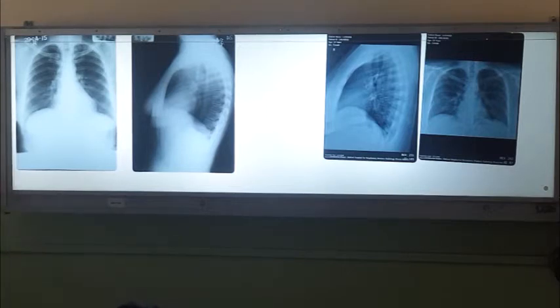Other thing is the X-ray exposure, right? Just remember like this, your intervertebral discs should be barely visible through the cardiac shadow if the exposure is good. Intervertebral discs should be barely visible through the cardiac shadow. If you can see the whole spine, then that is overexposed, so everything will be dark. And then you can easily miss a pneumothorax.